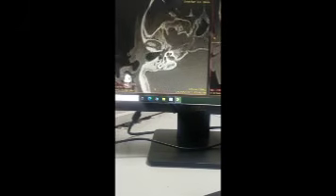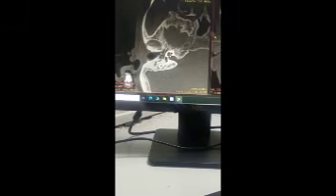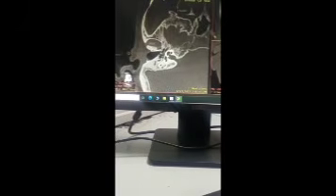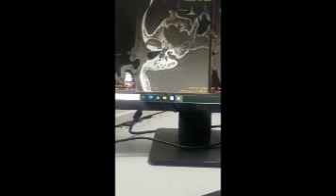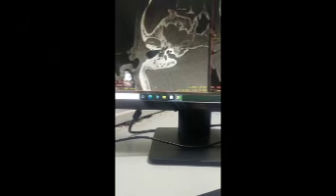Vestibule, and this is the cochlea. This is the modiolus of the cochlea. This structure, the modiolus of the cochlea. Okay, and this is the internal auditory canal. You can see that.